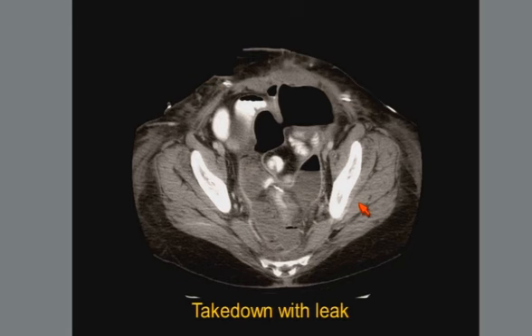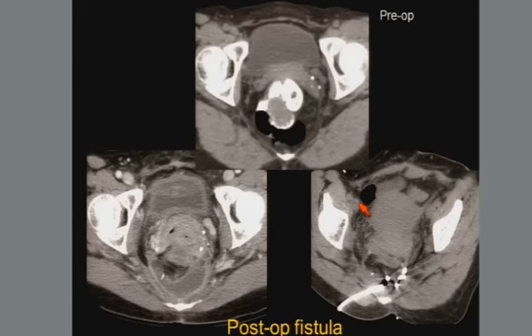And these are the ones where hand-wringing begins, because again, they don't like to take patients back in the early postoperative period. It's a very hard abdomen to operate in, so some of our surgeons like to temporize these patients with drainage. This is a patient with a postoperative fistula, pre-op. This is post-op, and you can see enhancing margins of this fluid collection. This was an abscess, and my group does a ton of percutaneous drainage of these things.